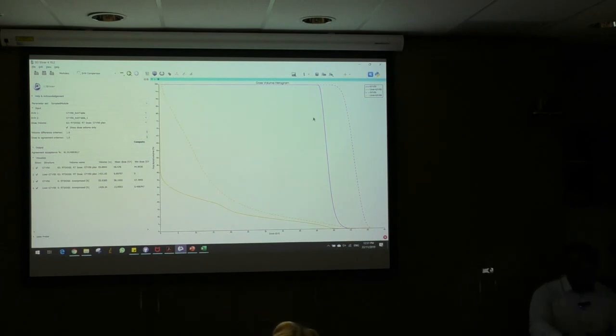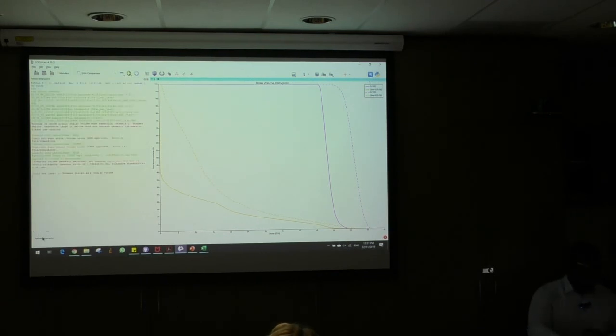Some other things about Slicer is pretty much everything that we've done today, Warwick and myself, you could write it up as code. You don't have to use the user interface. You could create code to do every aspect of what we did. So everything is completely programmable. And this is a very useful feature of Slicer for creating workflows in a clinical setting if you have tasks that are going to be repetitive. And you can do this in the Python interactor.